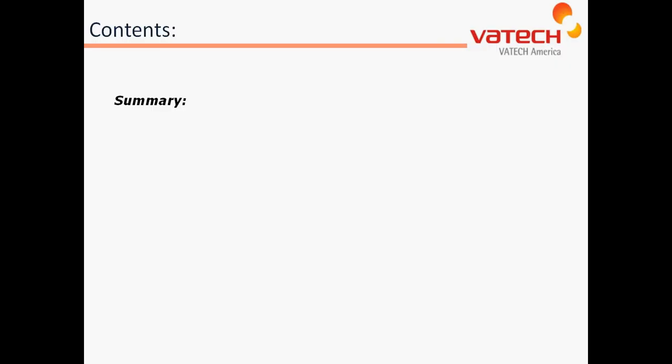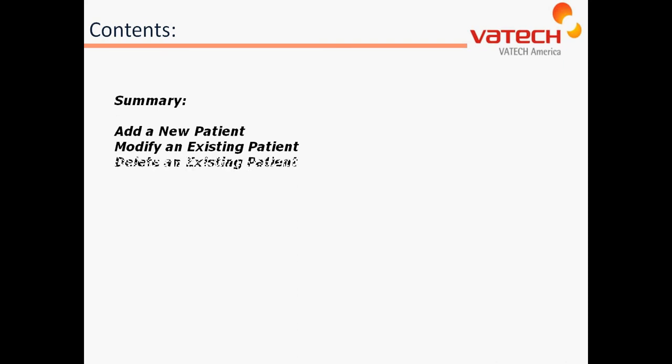This completes our patient add, edit, and delete tutorial. In summary, you should now be able to add a new patient, modify an existing patient, as well as delete an existing patient. Thank you.